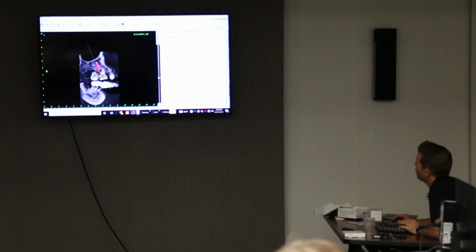So what you do is you click Move Outlines, and you want to get an outline size that's about the size of the inner portion of your guide. So let's just say here, okay? This green line under my mouse is the outline of my model currently, and I'm going to hold down Shift, and I'm going to take this green line and drag it, and do you see how it kind of invaginates it? I'm going to invaginate it up to past my guide tube.